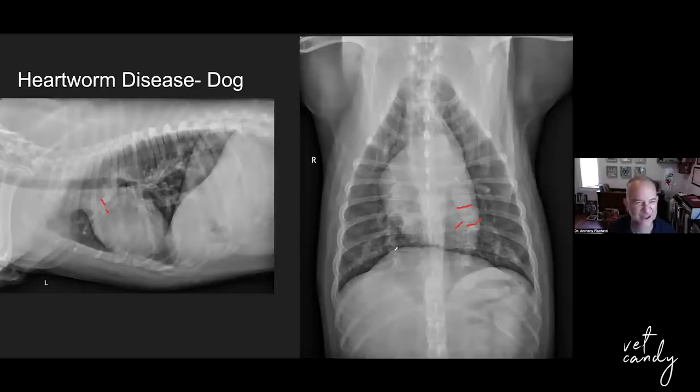So the heartworms, it's kind of a misnomer, right? Heartworms, they don't really live in the heart, they live in the pulmonary arteries. And those pulmonary arteries get big because of intima and tunica thickening, and then you end up seeing it radiographically. The pulmonary hypertension forms simply because of that wall thickening. The pulmonary hypertension also forms because they throw off little clots and they embolize. And so pulmonary thromboembolic disease and lower airway inflammation will contribute to the pulmonary hypertension in these dogs, okay?